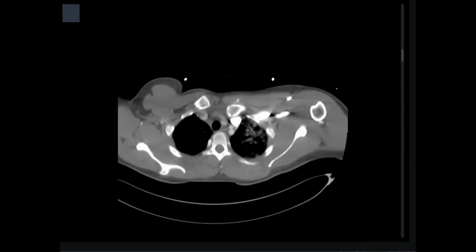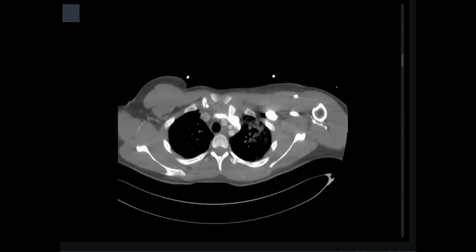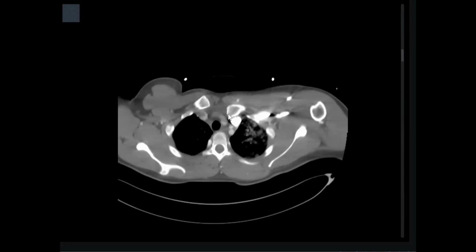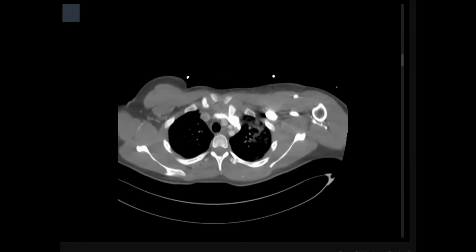I'll show you the case here. Follow this clavicle, my friend. This is a normal clavicle, and this is the sternum. So this is the normal sternoclavicular joint. What about the other clavicle? This is the other clavicle. It's directed posteriorly, pointed posteriorly, and this is the sternum. So it missed its location here and is displaced, or dislocated, posteriorly. In a posterior dislocation, it will compress the vessels directly, and the veins are vulnerable to injury. So this vein usually has a minimal leakage, but I couldn't see it. Okay, posterior dislocation of the sternoclavicular joint.